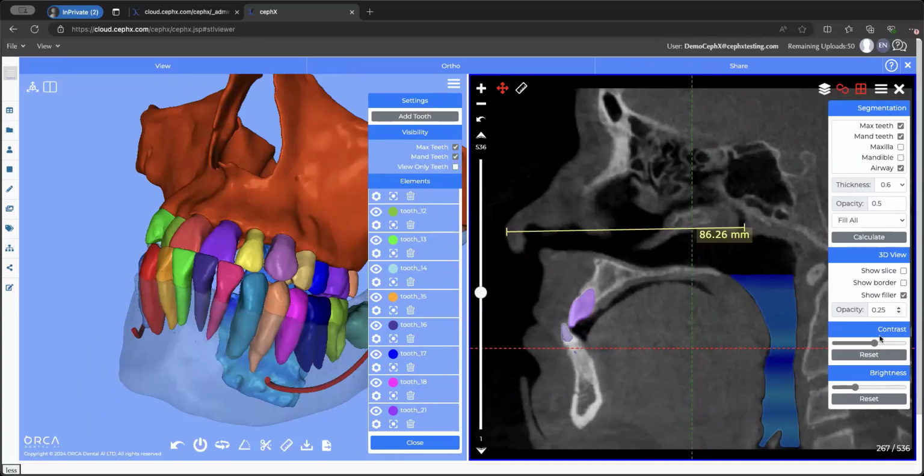And here's all kinds of tools allowing you to play with the outlines and with the fillers, and you can say, well, I only want to see outlines, and I want the outline thickness to be 1.5 and so on. You have different opportunities to play around with those features. And you can also take away the grid lines as well.